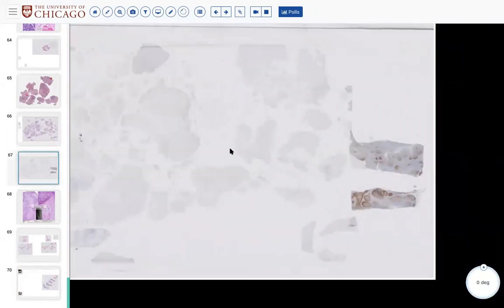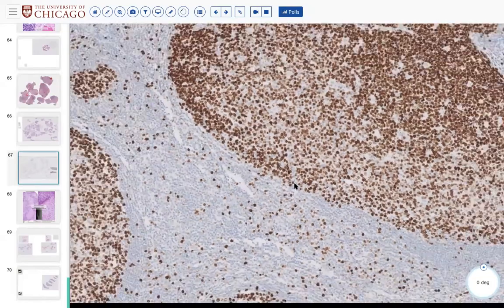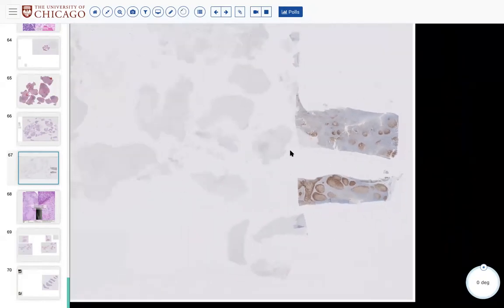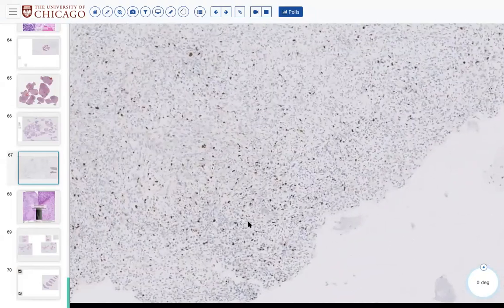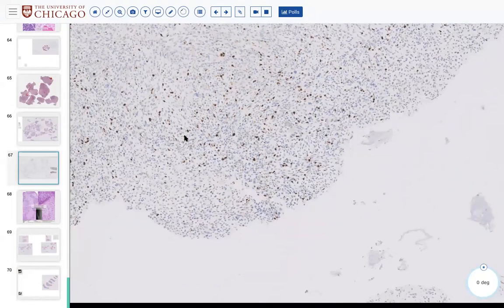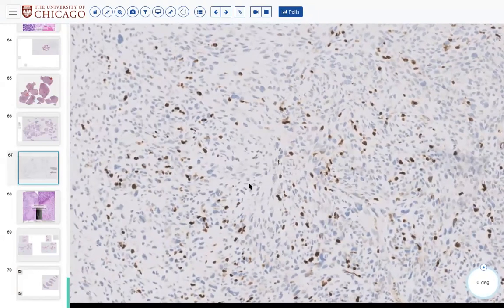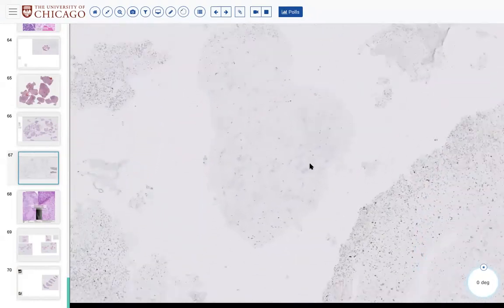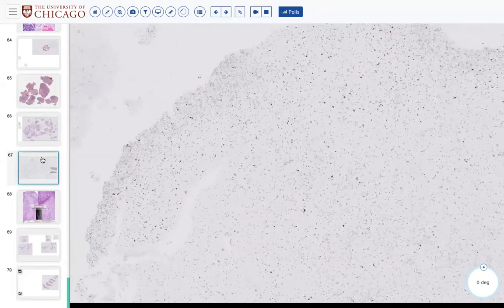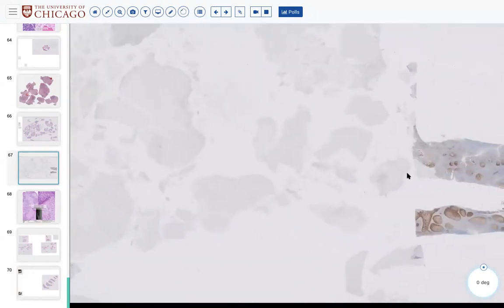I don't usually do Ki-67s, but we did a Ki-67 in this case, just out of curiosity, especially in that hypercellular area. And it's not nothing. So I'm curious in this patient to see behaviorally how this lesion progresses or does not, because I was a little worried about it. It has a relatively increased Ki index, whatever that means in this hypercellular area. So to be determined. I'm going to reorganize the order of this so it's in proper order. But because this was a nice recent active case, I thought it might be nice to share.